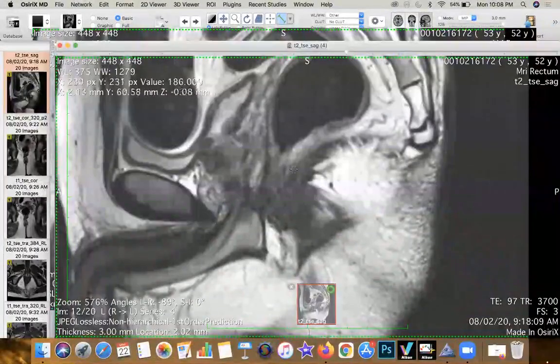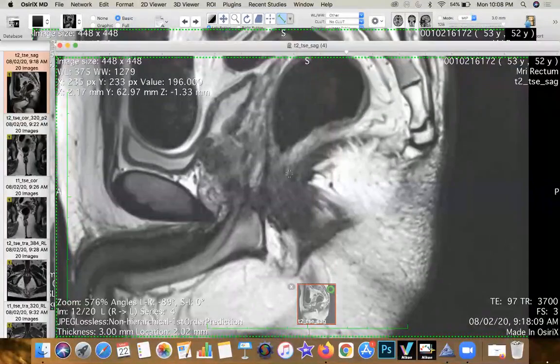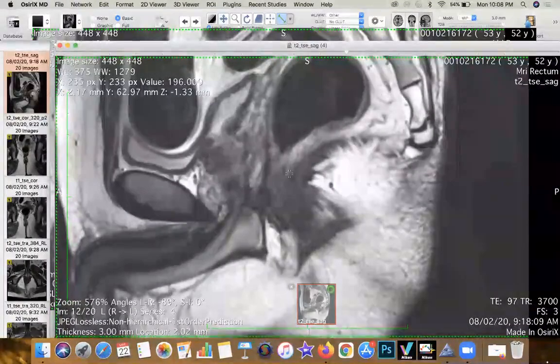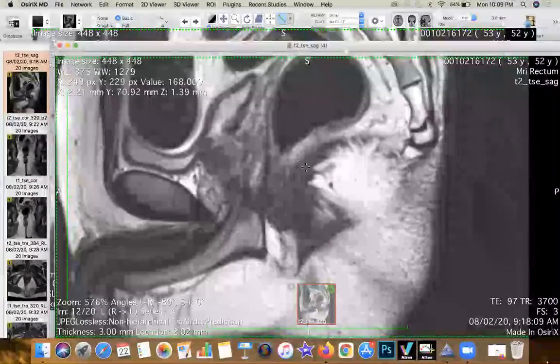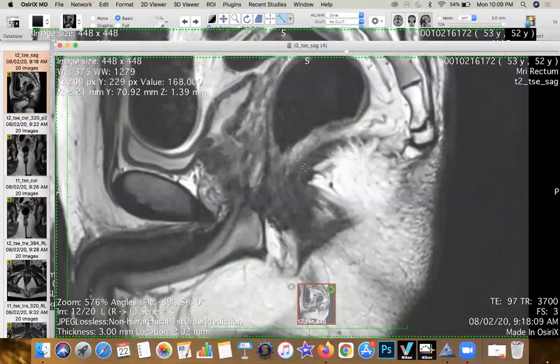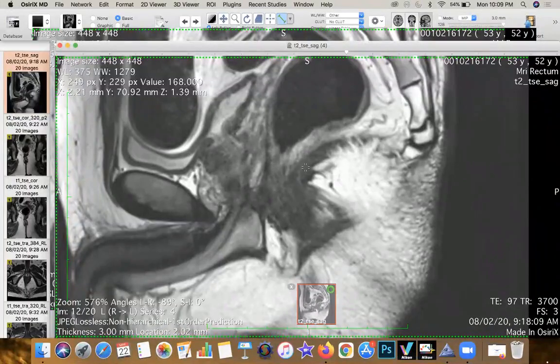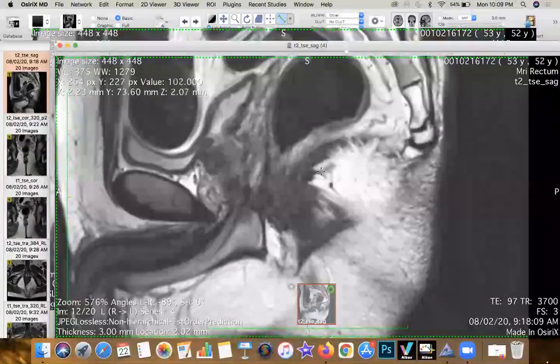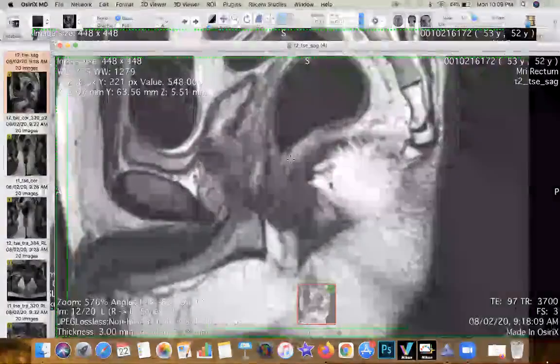So when you have patients with a normal hiatus, a normal descent, and a normal anorectal angle, that kind of confirms the absence of an overt structural abnormality in the pelvic floor itself. Please remember that the anorectal angle, when you're defecating or when you're squeezing, the variations in the angle are not going to be generally more than 15 to 20 degrees to the upper and the lower limit of your normal angles. So what I mean is, if you're squeezing, the angle is going to become more acute, and that angle is probably going to go down all the way to about 95 degrees. It's not going to go to 80. That means it's generally an overaction of the puborectalis itself.